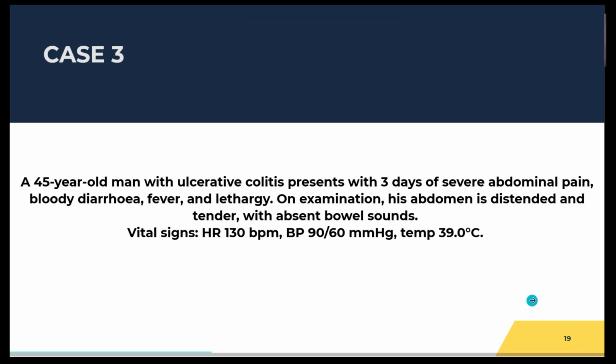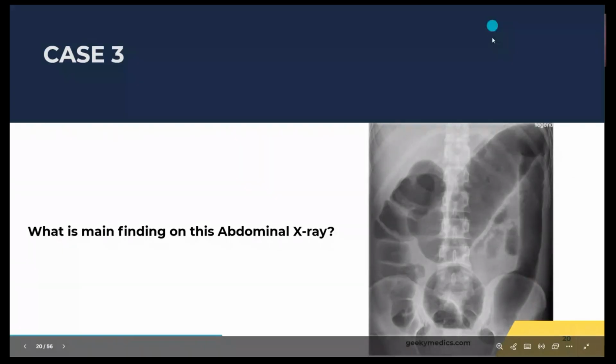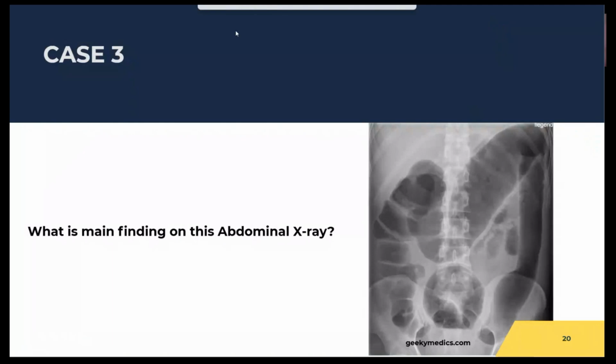I'll just put that on. Okay, so another main finding question. What is the main finding on this abdominal X-ray? So this one's a bit harder than the others. Okay, someone's put toxic megacolon. Okay, and why do you suggest that, Ralph? Okay, yes, true.